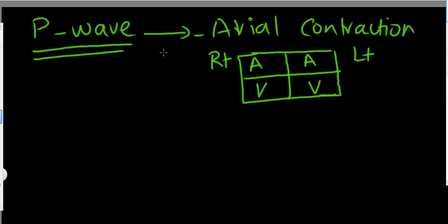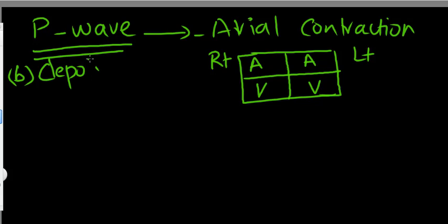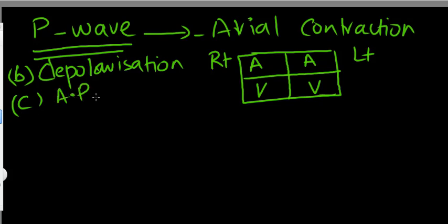Now, in other words, they can use other terms like atria contraction, atria depolarization, or when the action potential of the atria reaches its peak.